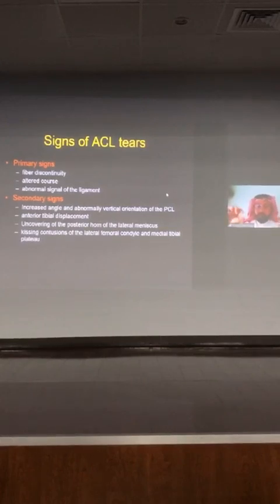And if there's uncovering of the posterior horn of the lateral meniscus, I will also look at the sagittal sequences, and I will see the position of the tibia and the position of the posterior horn of the lateral meniscus, if it is uncovered or not.